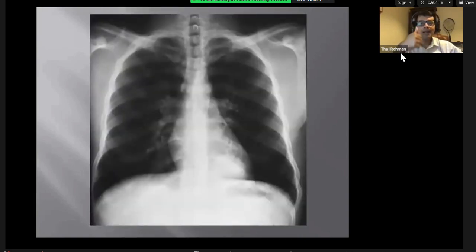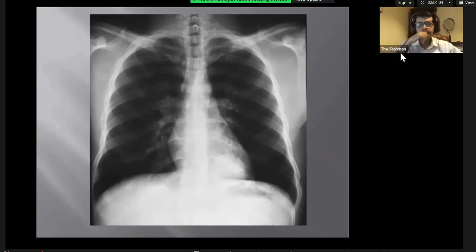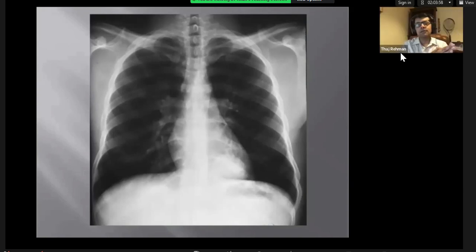This is the same patient's frontal X-ray, PA. On this PA chest radiograph for the same patient, there is an abnormality in the left lower zone in the retrocardiac region. There's a rounded soft tissue density. Excellent. So you did pick up the left retrocardiac opacity there.